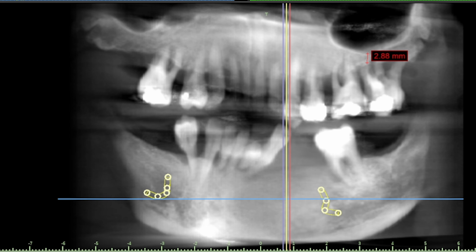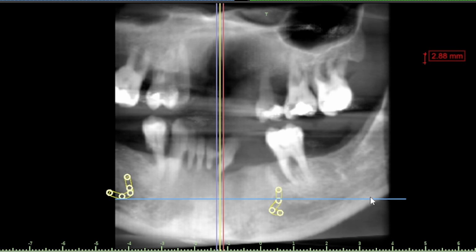We've still got quite a lot of bone in this case. I'm just going to redraw this, we call it the panoramic curve. It just makes this picture a bit clearer. Now, can you see these little yellow bits here? These help me visualize where the nerve on the lower jaw is. So we've all got these nerves. They come out roughly at the corner of the mouth in the middle here somewhere.